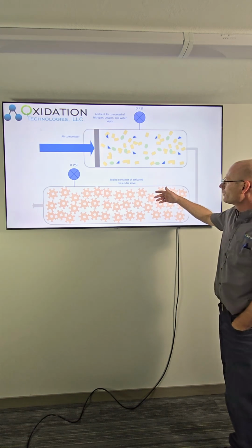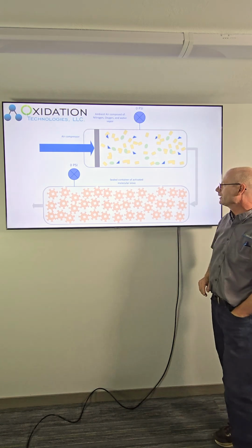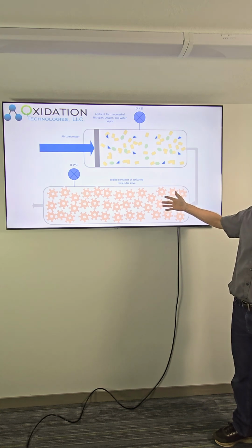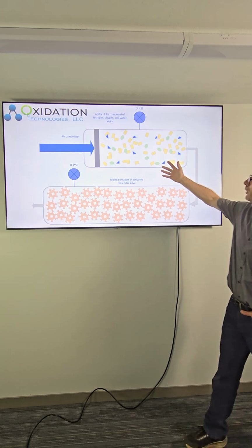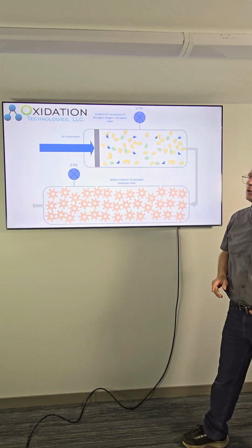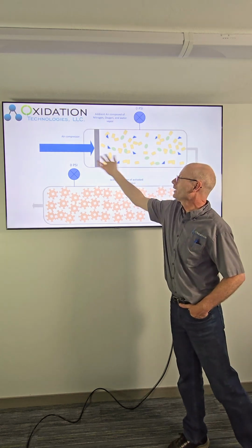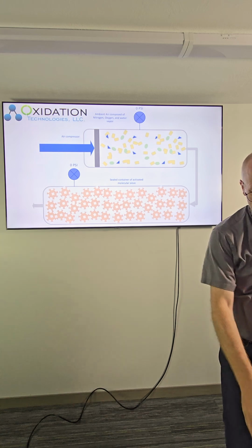Okay, so now I'm taking some of that molecular sieve and putting it into a sealed container to protect it from any of the gases, any moisture outside. We call this the sieve bed. And this is a component in these oxygen concentrators. Another component here is an air compressor, just representing a mixture of these molecules that form air into this air compressor. Right now we're not putting any pressure, nothing's turned on yet, but we've got a compressor and a sieve bed.